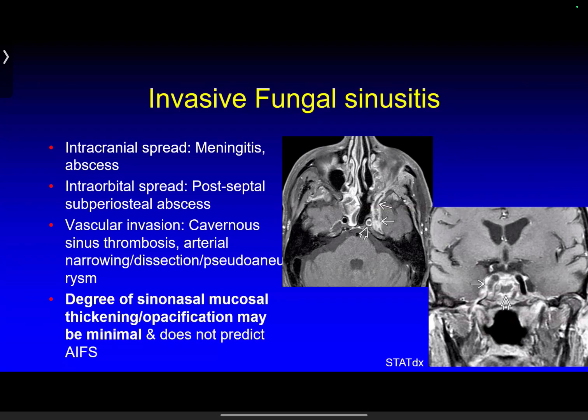Important point is that the degree of sinonasal mucosal thickening or opacification may be minimal, and it does not predict the presence or absence of invasive fungal sinusitis. Always look for that soft tissue where it does not belong.